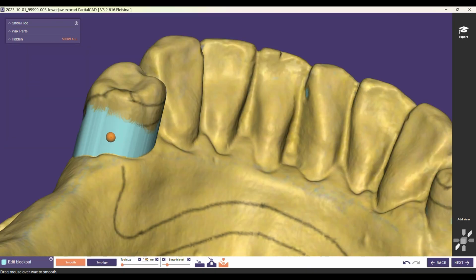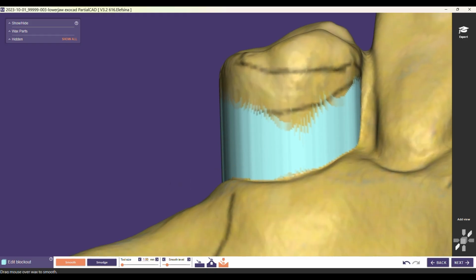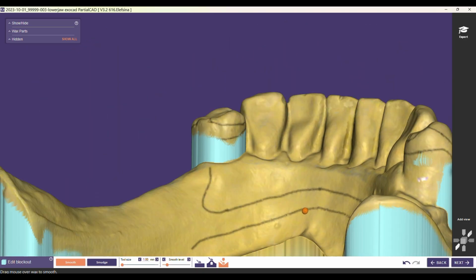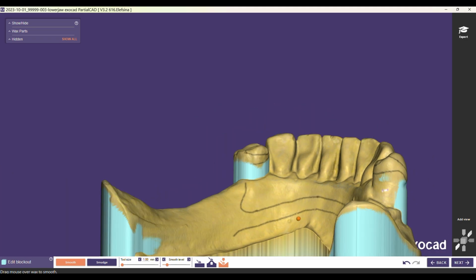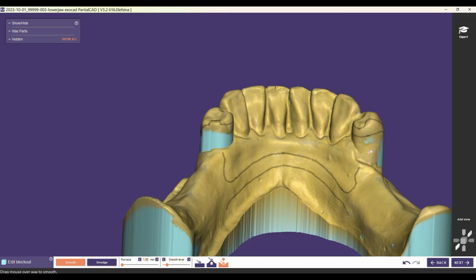If, of course, your tooth has a very big distal concavity, which is usually very common in premolars, then you will notice that a lot of block out wax is added here. Please do not touch it. You need that area to be bypassed by the proximal plate as it rises up, and only contact the tooth near the occlusal surface. Of course, heavily contoured teeth will have to be treated or recontoured prior to giving a proximal plate, because if you try to jump past too big of an undercut, then you're going to create a food trap later on.